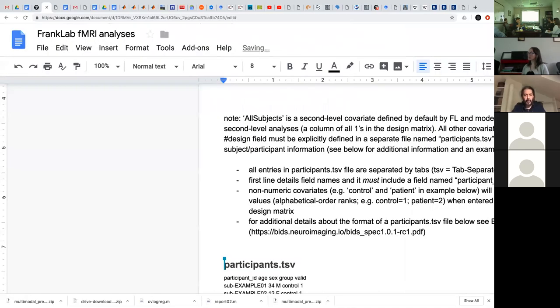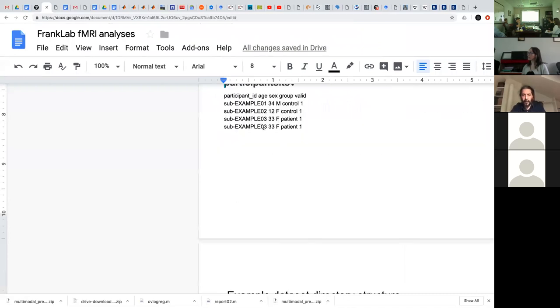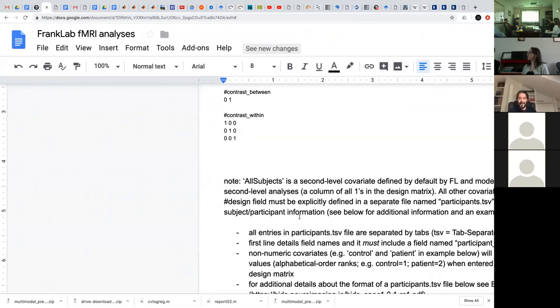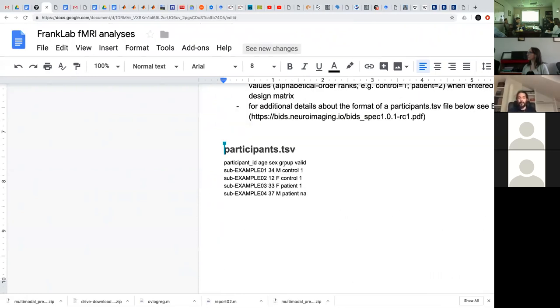You mean if you have something like that, let me see. So if you have another patient here that has, I don't know, 7, and there's also a patient and it's male, something like this, you mean? Yeah. Right, that will work perfectly fine. Oh, right, I see what you mean. If you want to do patients. Right, well, everyone's in the valid group.